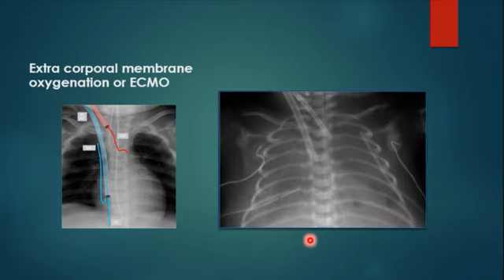Okay, now jumping into a very important subject, especially for final board examiners, we're facing this type of spot diagnosis pictures, which is called ECMO, or extracorporeal membrane oxygenation. Most of us don't have any idea about what this is. Basically, in short, the idea of this type of system is to provide aeration for the blood circulation for the neonate when his lung does not function well and he does not get enough oxygen.